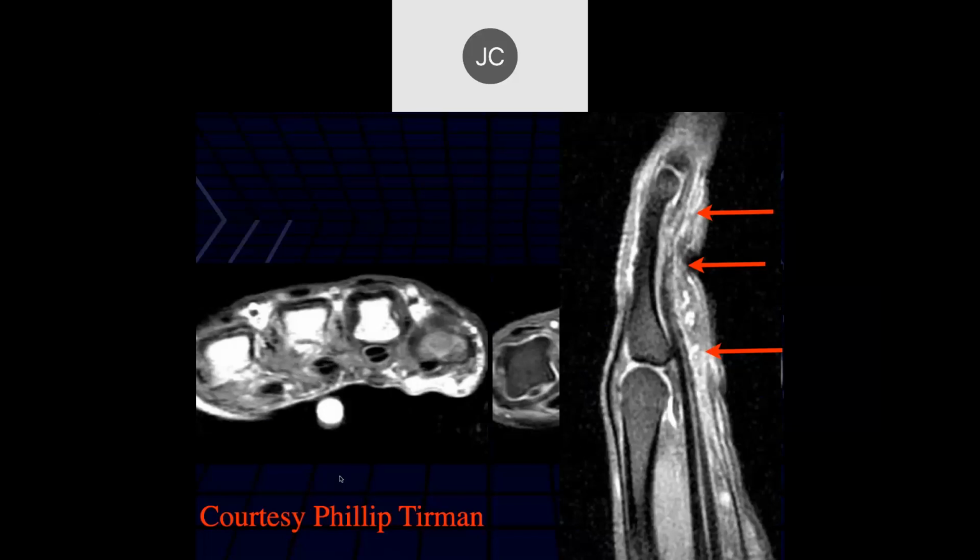Maybe the Dupuytren contractures. So this was Dupuytren's contractures, right? Okay. We'll talk more about that in the inflammatory section as well. It looks like the phalanx is bent. I don't know if I'm... It's chronic disease. Maybe it has remodeled. I'm not aware of noticing that, but you're right. It does look like it might be a little pretty rare area also. Yeah.